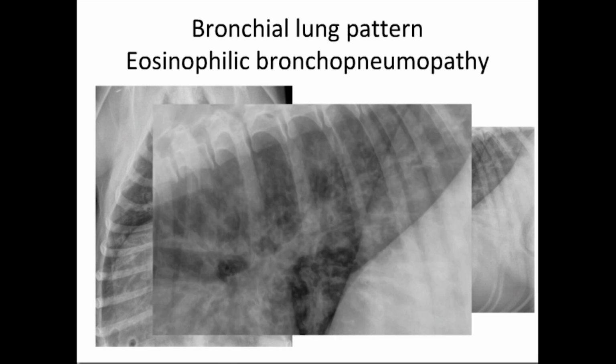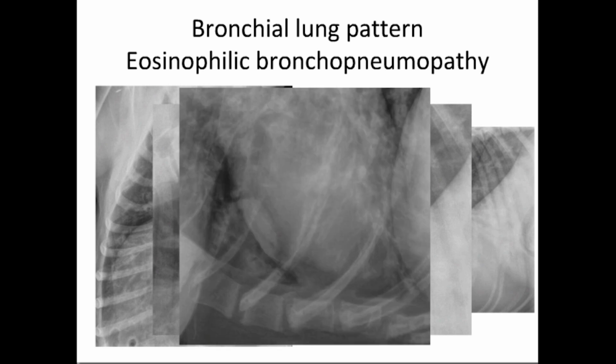If I just blow up the radiograph so you can see the fine detail a little bit better, we can see here thick hazy margins around the walls, and here we see the donuts. And this continues not just around the hilus, as we saw with the mineralized patient, but right the way out into the periphery of the tissues. Here we can see a donut all the way out here. It's less obvious because obviously when we come out to the margins, the bronchi are relatively smaller, but it's still there and shows why it's worth making sure that you increase the size of your radiograph, or blow it up if you have a digital image, to make sure you look for that extension out towards the periphery that confirms this is genuine pulmonary disease.